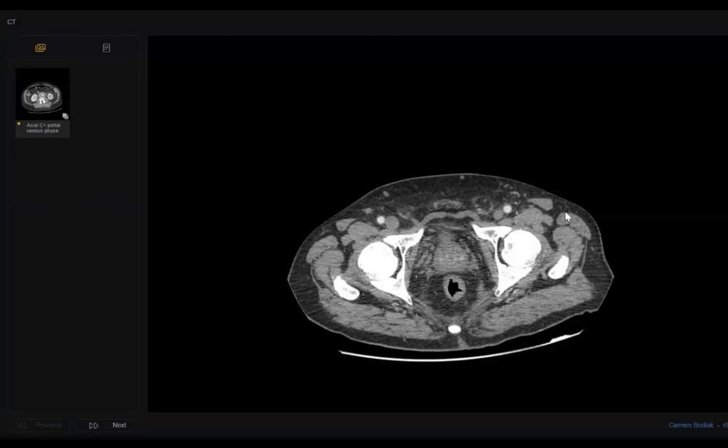As the pancreas was normal, I just have to search for other IgG4-related autoimmune disease. So the pancreas was normal, so there is no autoimmune pancreatitis.